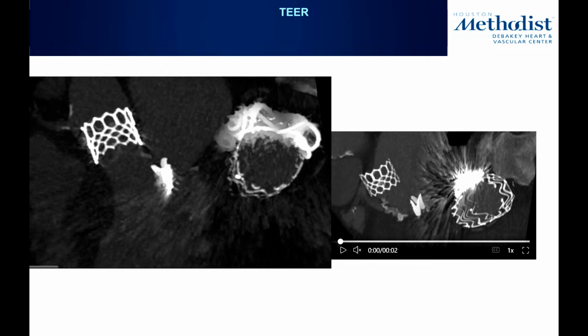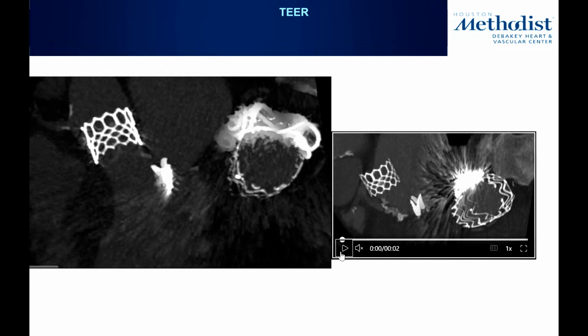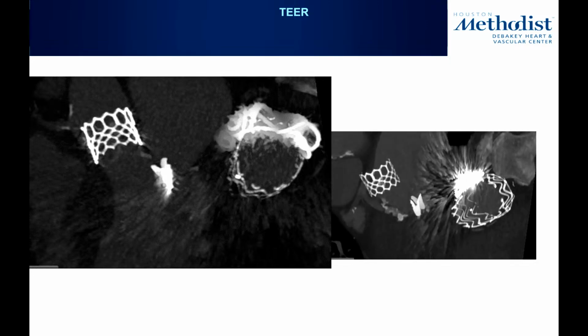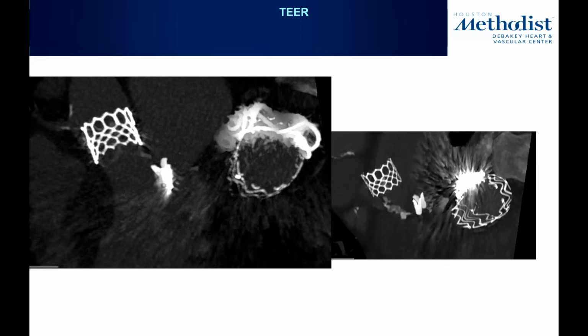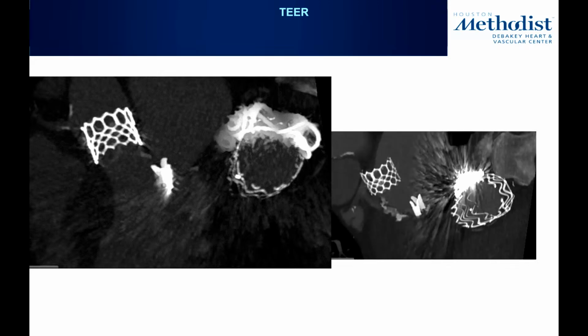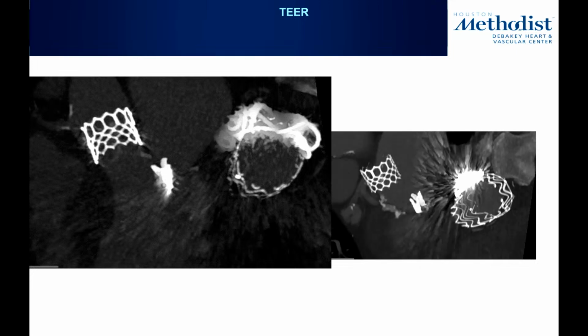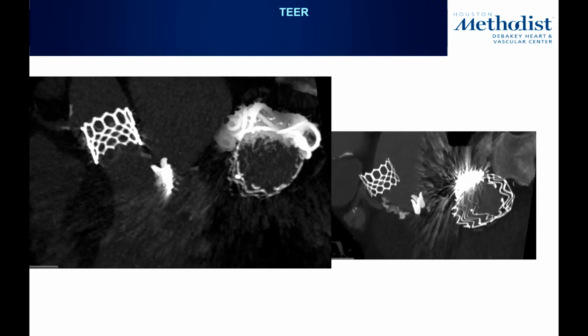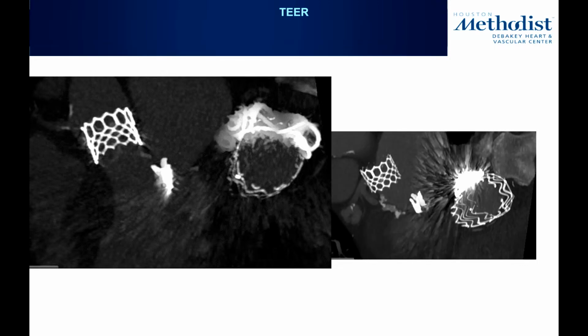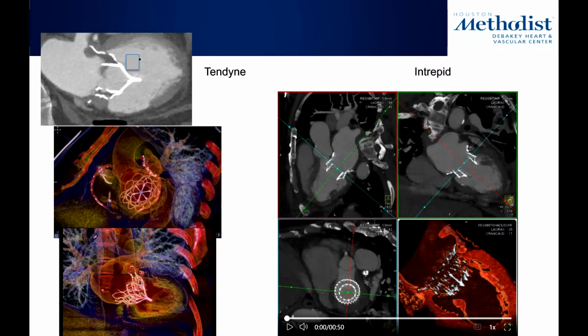And again, I want to show you what mitral clips look like. And we're getting some referrals now, assessment of patients with a prior clip and recurrent MR, and the interventionalists want to see what the remaining valve area is to determine if they can go in and put another clip. So I expect as the TEER population grows, some of them will eventually fail, and we're going to see more and more. So we've got to get prepared for this.